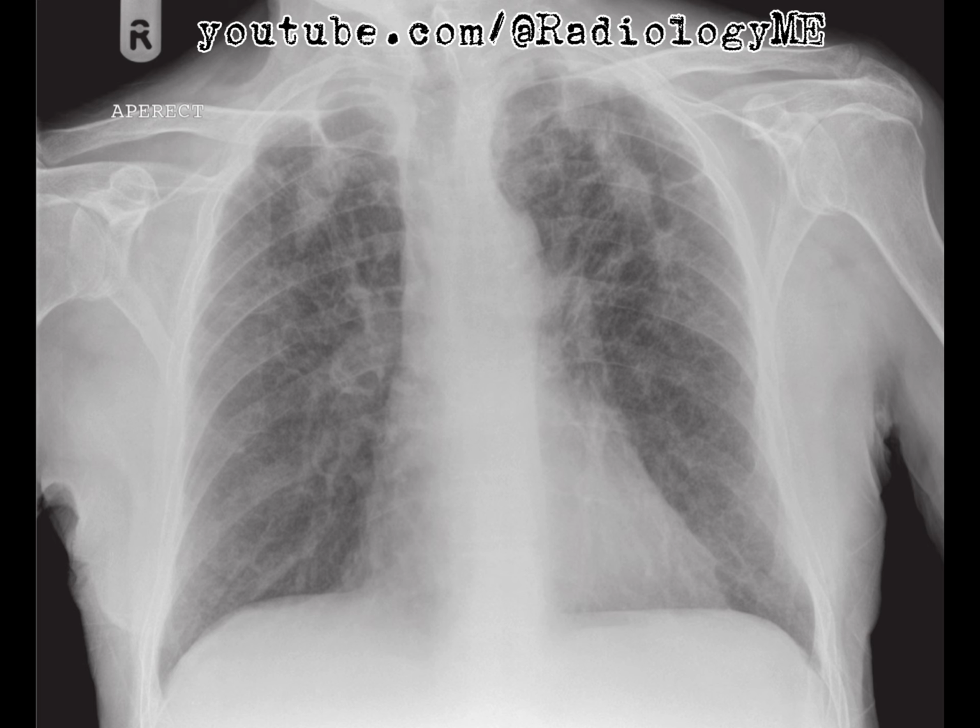If the findings were asymmetrical, though, I'd start considering other things. I'd want to look for well-defined edges to the fibrotic changes and any accompanying bony changes, which might suggest the patient has had previous radiotherapy. Another thing to keep in mind is that hilar lymphadenopathy with eggshell calcification and upper zone fibrosis is very characteristic of silicosis. But we also see this pattern in conditions like sarcoidosis. What I'm not seeing here, though, is inactive tuberculosis, which typically doesn't present with hilar lymphadenopathy.